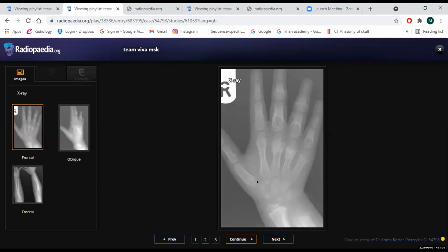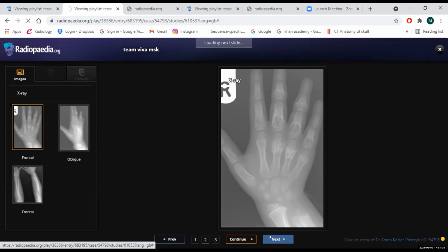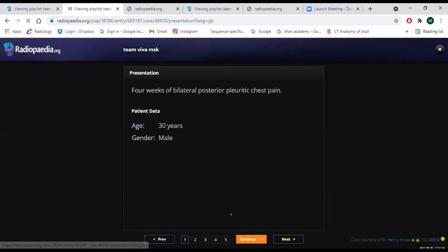These are multiple enchondromas, and along with this there is Madelung deformity. Your differential was fine because you suggested multiple osteochondromas, but these are all benign looking lesions, so you were right.